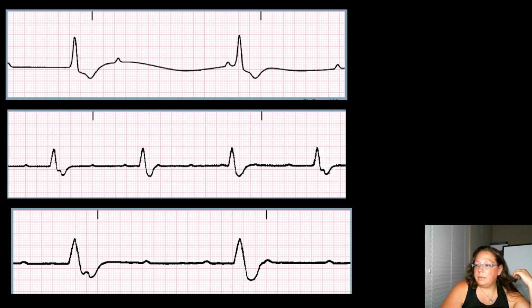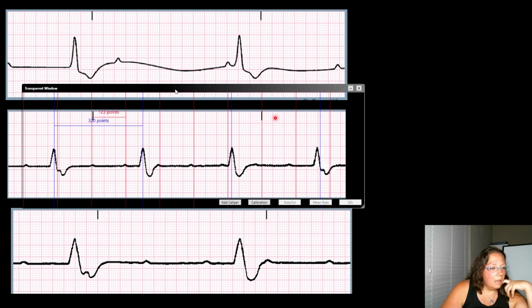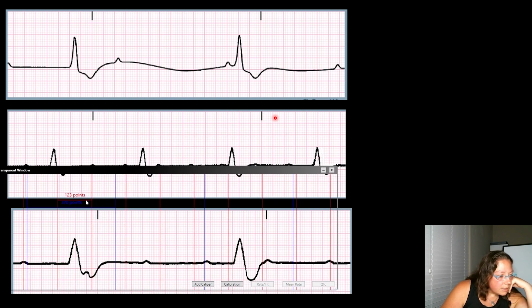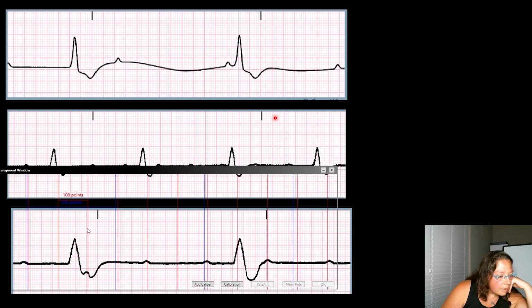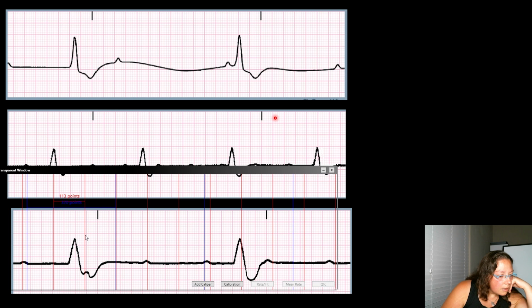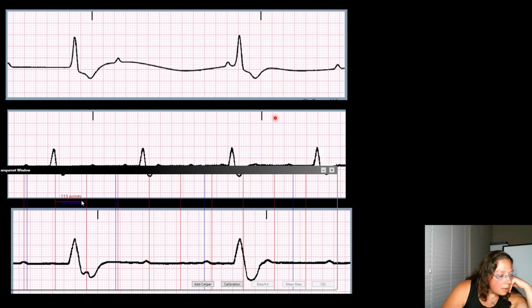Last example. Let's move this to the P's. Okay, and then move this one to, this one we're gonna actually get rid of this one.